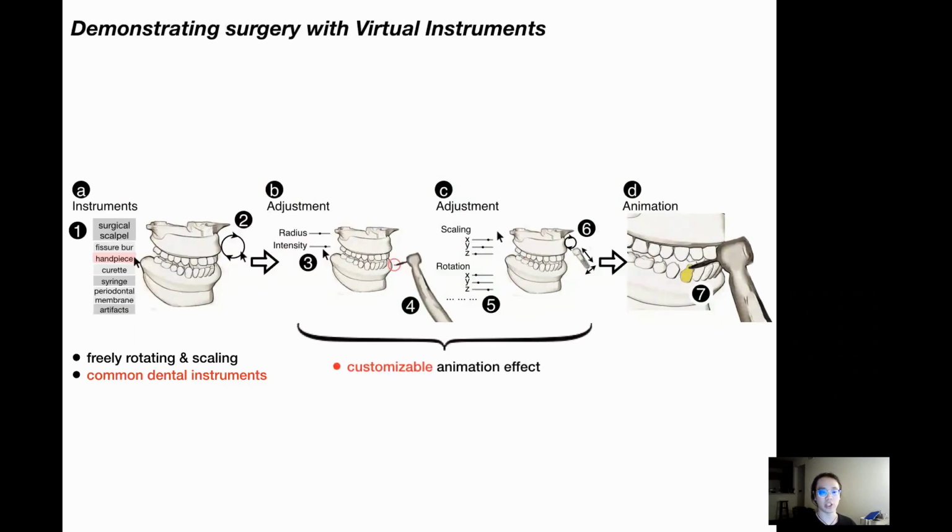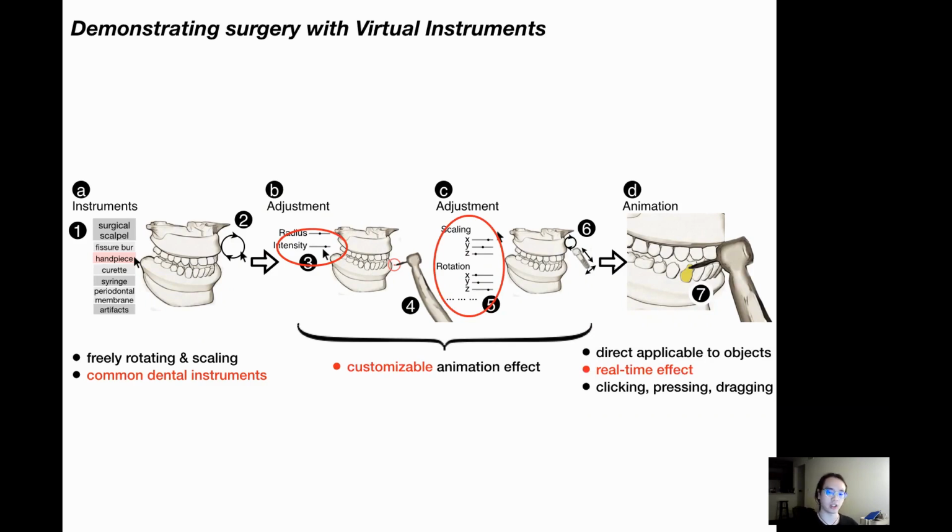For each selected instrument, we visualize the tool, and we also allow the user to customize the animation effect of the tool using sliders. The tool can be directly applied to any object by very simple operations, including clicking, pressing, and dragging, and we show the real-time effect of them.